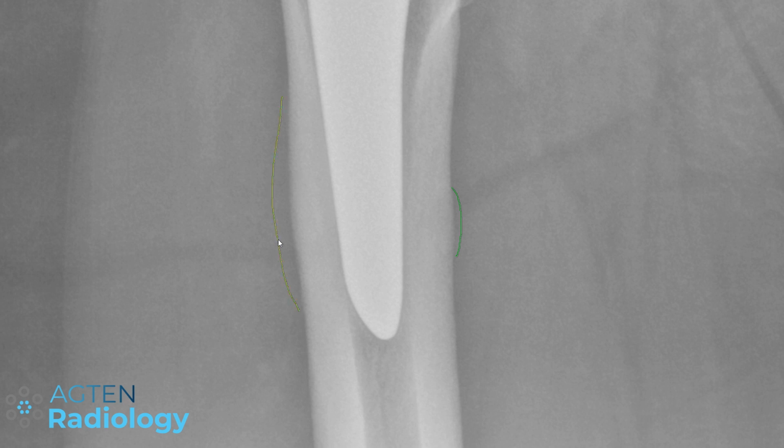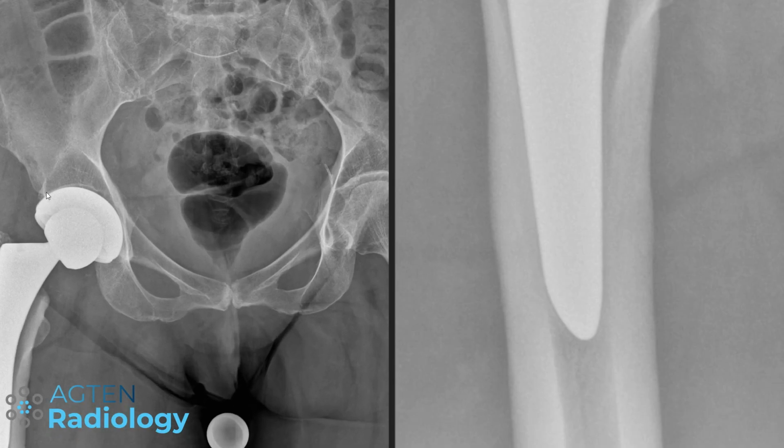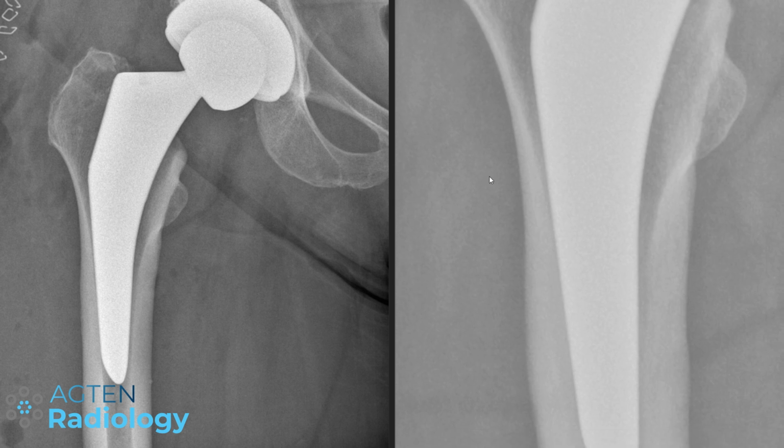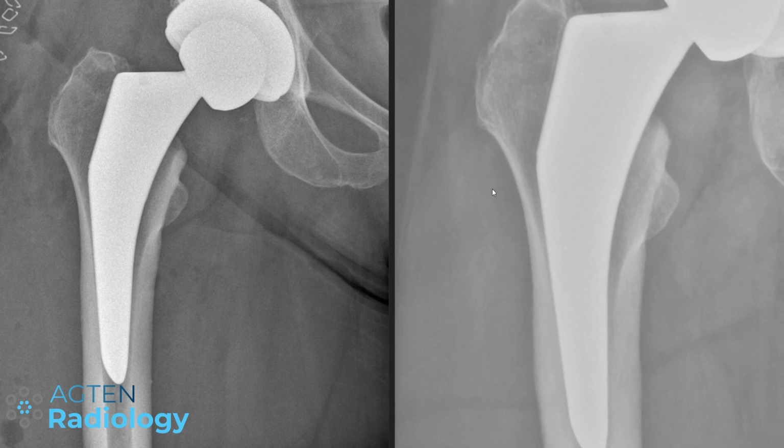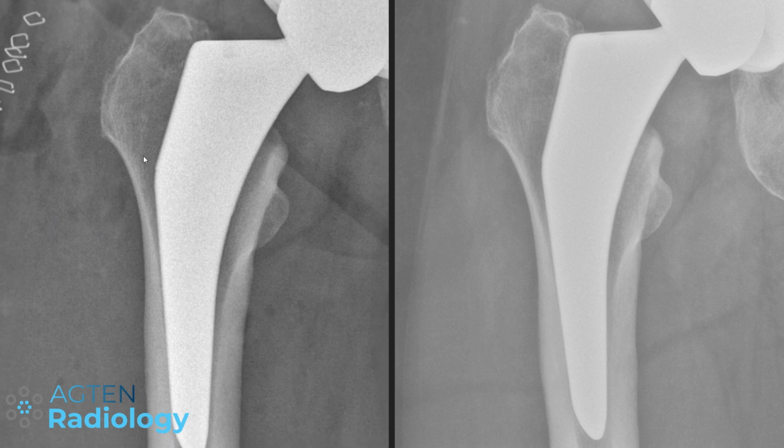of the cortical bone. And we can compare this certainly with the first post-operative radiograph. So let me just quickly load that one in. So that would be this one here, and we can just zoom into this location where we can see the whole shaft really, and maybe also here, something like this, right?